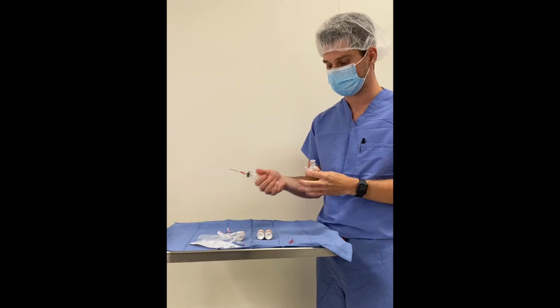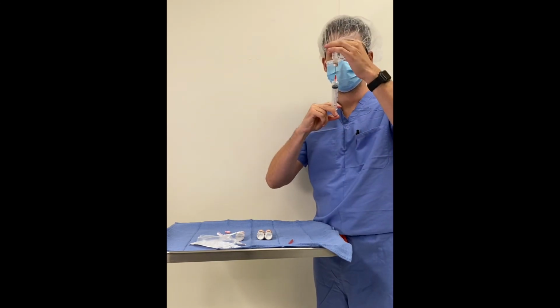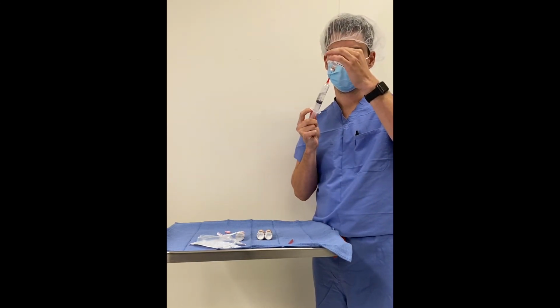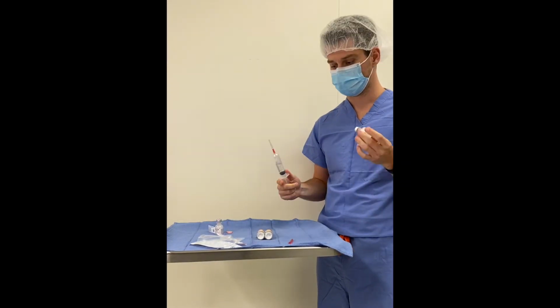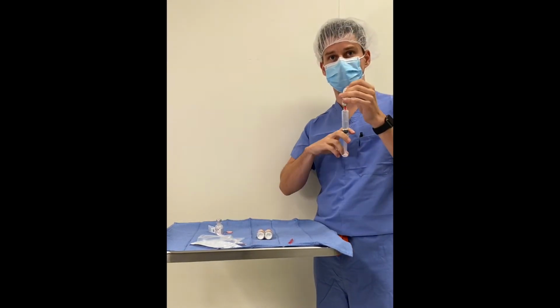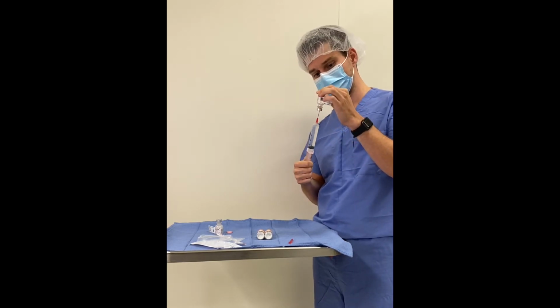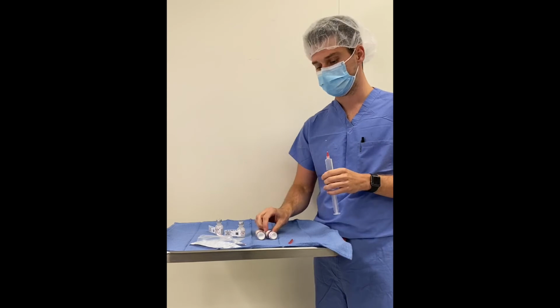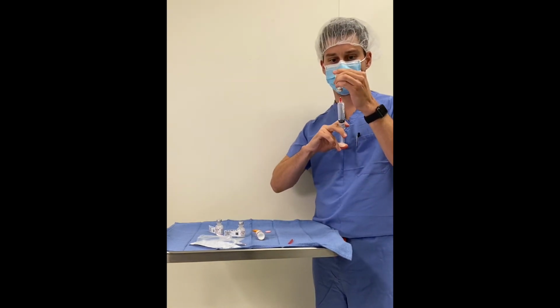When drawing up any medication, it can help to put air in the syringe beforehand. Turn the medication bottle upside down and insert the needle into the bottle and inject the air. This increases the pressure in the bottle and causes the medication to flow easily back into the syringe. Pull back on the syringe to draw up all of the medication. Be sure to keep the needle tip below the surface of the fluid so that you don't draw up any air.